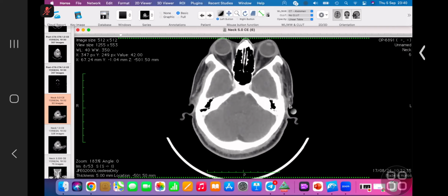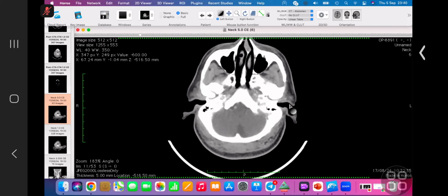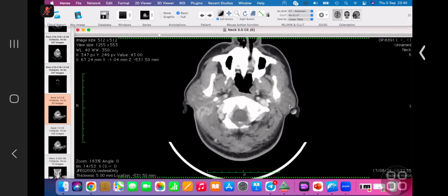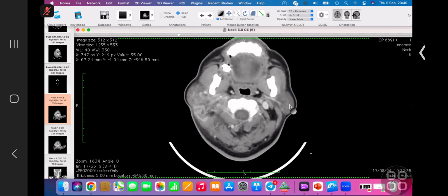Do you want to ask any history? You are free to go. You can ask me any history. Is the history long, or is this jaw pain chronic or acute? It started just 2 days ago, and he had a severe fever for the past 1 week. But the jaw pain and neck swelling started just 2 days ago. Can I ask about the patient's age? I think 50.